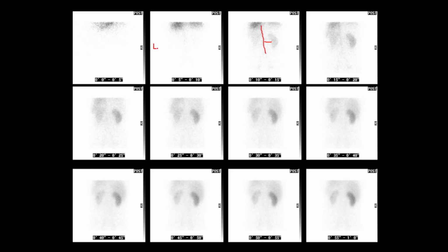There should be an L there for left. Again, this is a posterior view, remember? So you can see that in many ways this was a helpful picture to make, because we can see clearly the difference between the two kidneys and the difference in the early perfusion between them, which can of course be due to many things, but obstruction would be a common one. So here are our later pictures, and although you might say, well, I can see that there's a difference here, it might not be so evident that it was in the first minute, the very early phase, that the patient had the poor perfusion.